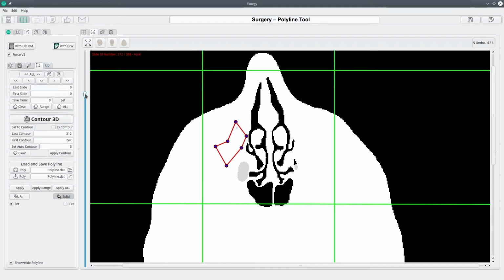As with the 2D brush, we want to have the polyline in every individual image. To do this, we just click here. Click W or S to go down or up from the image to see the difference. Here's a polyline, here's no polyline. Then, to get this polyline to the next picture, we click here to copy and then go down and paste. And there we already have our polyline in our second image.